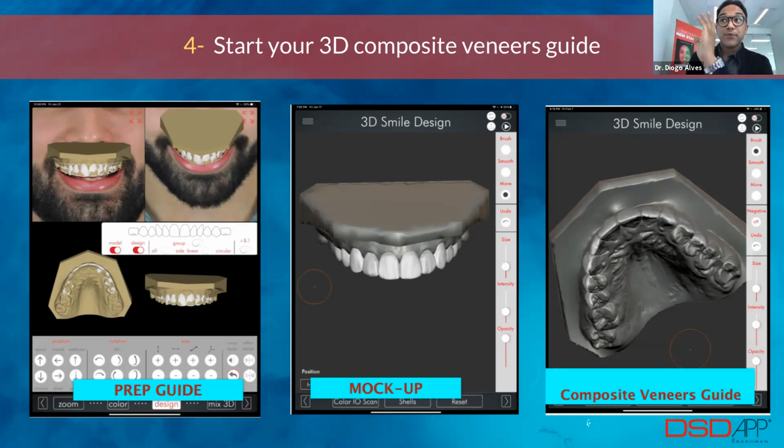Okay. And if you look all the way to the bottom on that first screen, you have that occlusal view. And if you look closer, there is a white line. This white line is the occlusal curve. That is something that you would take a note of with the patient chairside. You would analyze the overjet and the overbite.